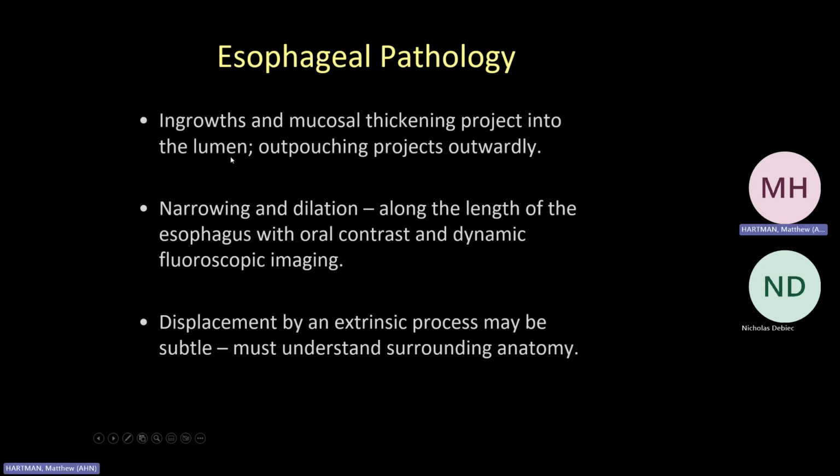Innies project into the lumen, outpouchings, outies project outwards. We'll see examples of those. Narrowing and dilation along the course of the esophagus, and displacement, something pushing or pulling the esophagus. So let's see examples of these.